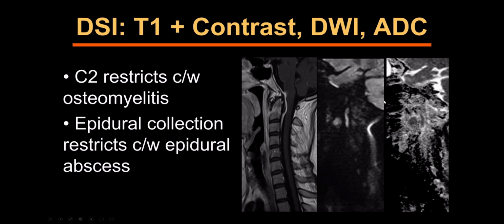So we started to do diffusion-weighted imaging, and these diffusion-weighted images are not the prettiest things on the block, but notice how nicely you can see the restricted diffusion, and if you really squint, you can even make it out on the ADC that shows you the epidural abscess in this patient.